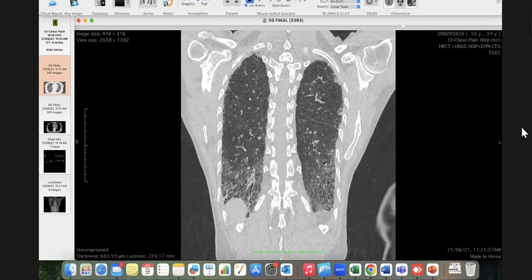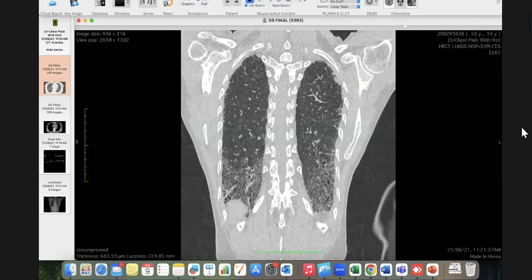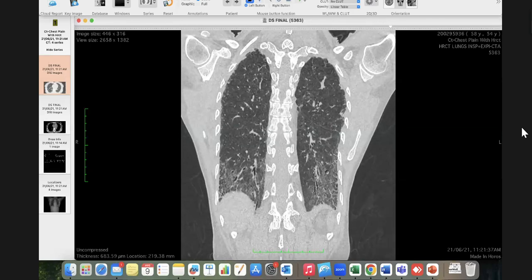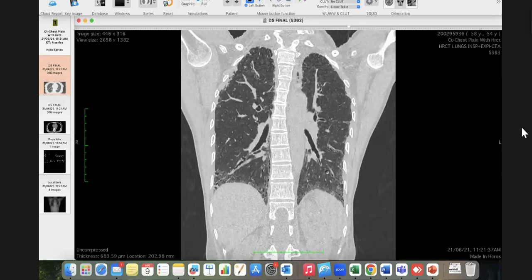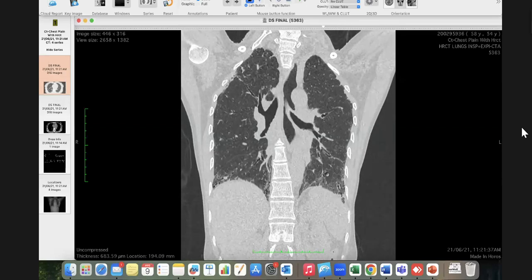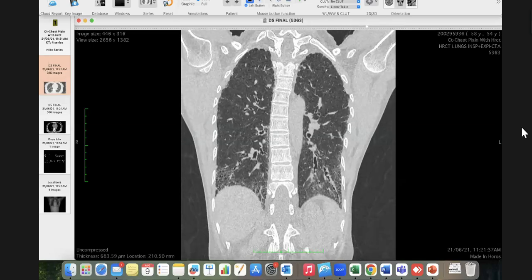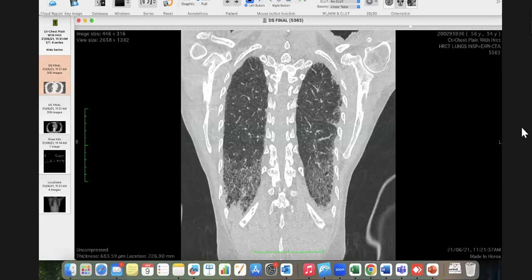And if I show you this image, you would agree that there is definite fibrosing lung disease. The findings are more in the lower lobes, and the zone of demarcation between normal lung and the diseased lung is very sharp, something which we call the straight edge sign, and it is typically seen in connective tissue disease ILD. So, just to tell you that if you see this spectrum, even if you don't see a dilated esophagus, which is so obvious in this case, then do suspect an underlying connective tissue disease. Otherwise, this is a UIP pattern.